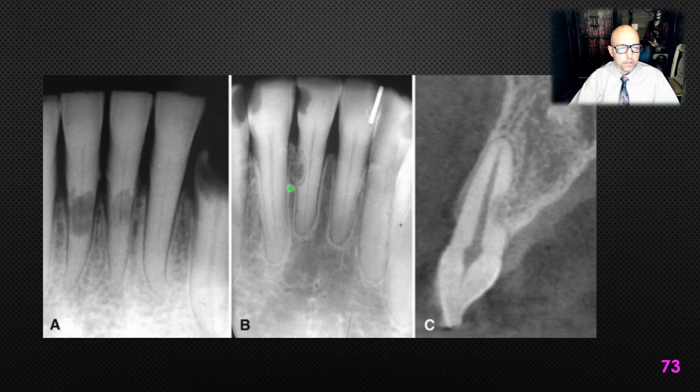So here are a couple other examples. I like this one because you can see the bone growing in from the distal surface of the root of this tooth, PDL space still remaining intact. In this case, you see radiolucency on the outside, and so this is buccal or lingual resorption. It's still external resorption. I can tell that because the canal spaces remain intact going right through where you see this radiolucency. And so this is either buccal or lingual external resorption.